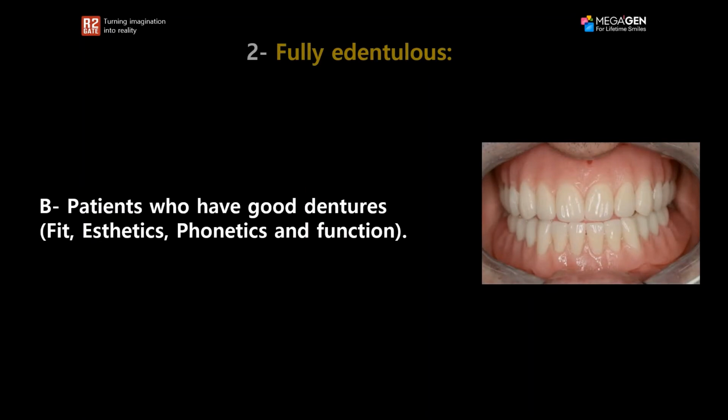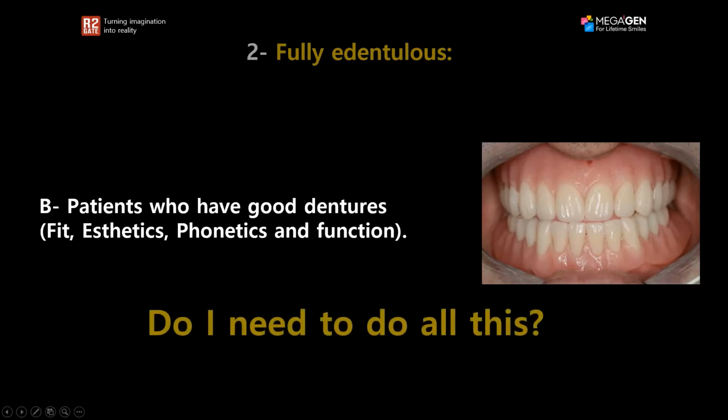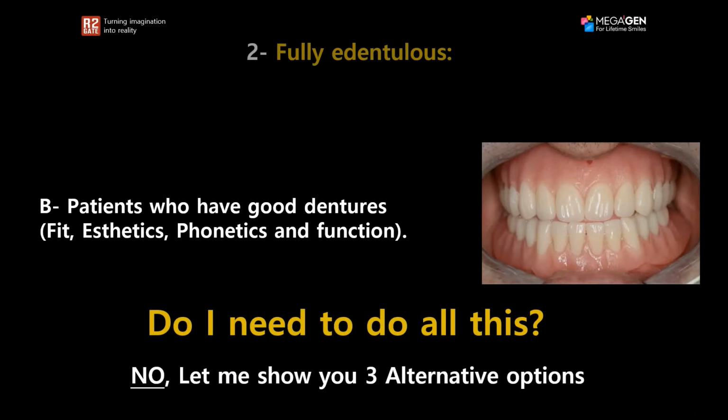What about patients that have dentures that are good dentures? They fit well, they look good, and the phonetics and functions are actually adequate. In these cases, do I really need to do all that previous workflow? And the answer is no. So let me go ahead and show you 3 alternative options for patients that already do have good dentures.